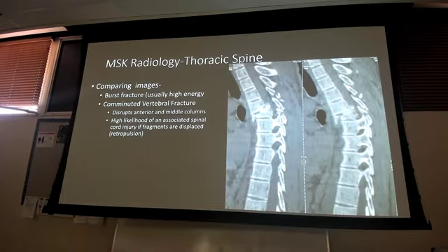And then we run into our burst fracture. Yeah, I hate to see it too. High energy fracture, usually MVAs. Usually motor vehicle collisions, MVCs, motor vehicle accident, whatever you want to abbreviate it as. So these are going to be your high energy fractures of your vertebrae. Not always in the thoracic, but very commonly in the thoracic. Seatbelt comes across there. A lot of pressure from that kind of stuff. Like high likelihood of spinal cord injury because these fragments can just shoot right into the posterior segments of the spinal canal and get in there and cause that.